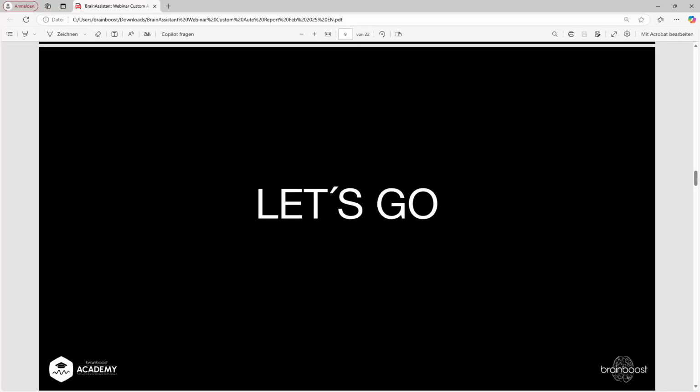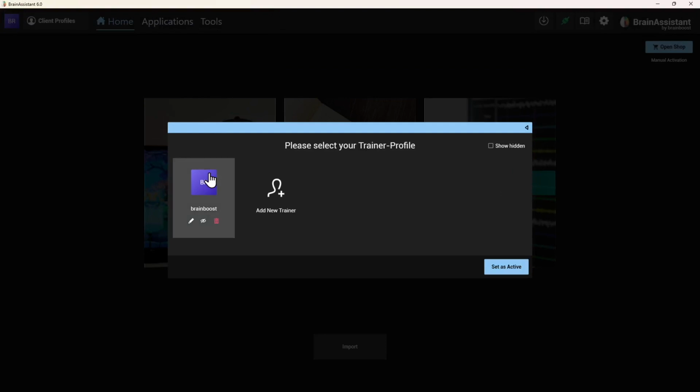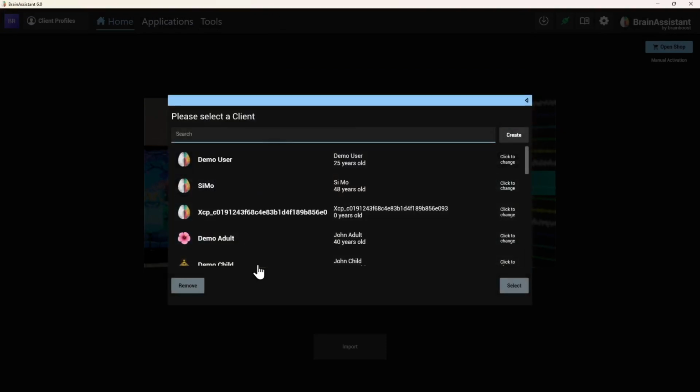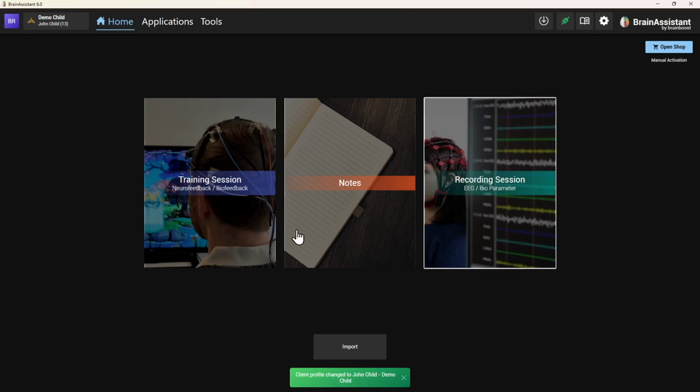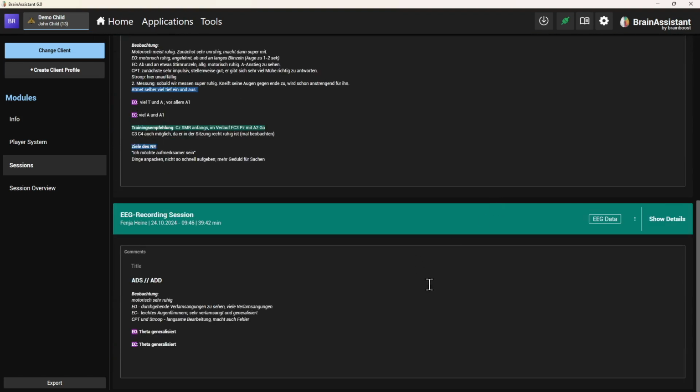So let me share my BrainAssistant here. You all know you need to select a trainer, and I'm going to select my demo client. So let's assume we did a beautiful recording. Let's get into the client. And now let's take a look at the first client we get, show details.